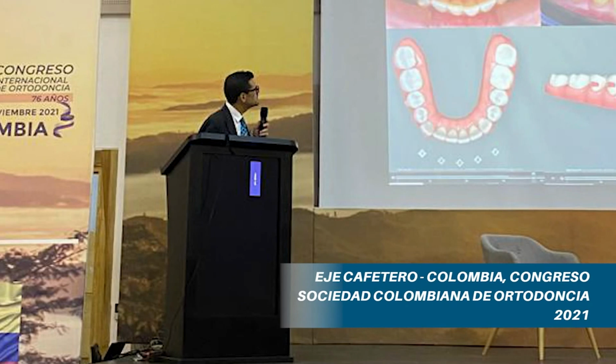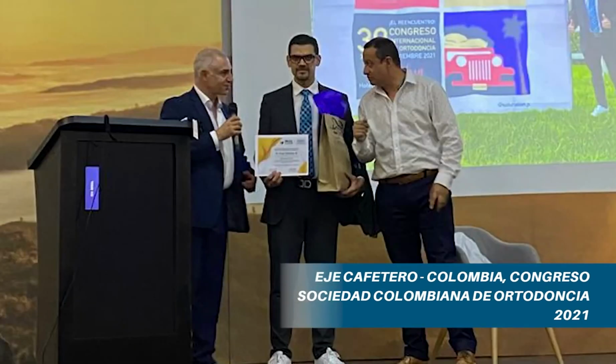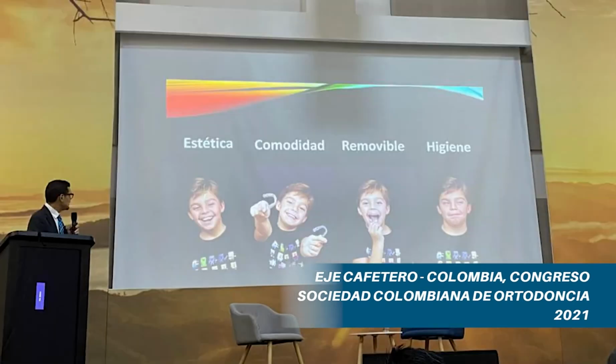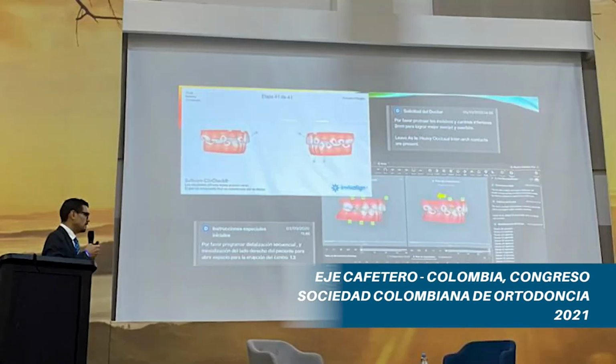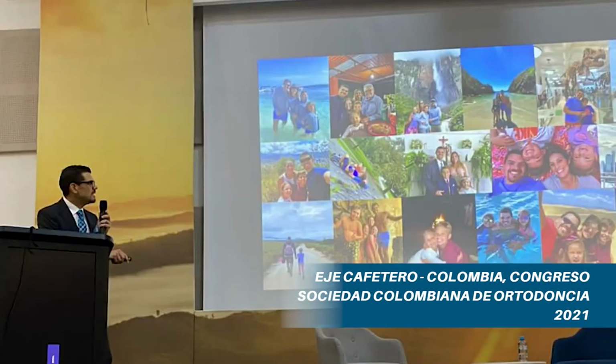If we don't need further expansion, make a very moderate expansion, or as much as possible, to gain space with less IPR and improve contact points, and proceed to the occlusal adjustment. If it is a posterior expansion, it must be done from the superior occlusal view, and select the contact point view tool.